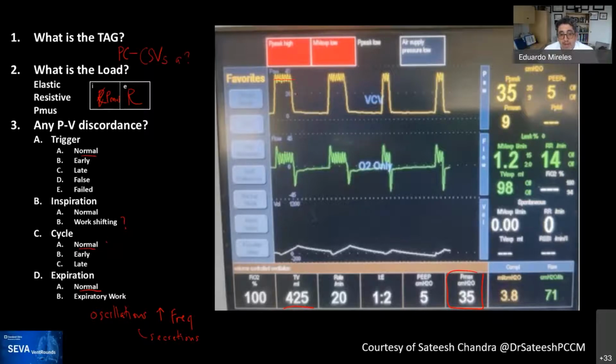And I will ask Rob, I mean, I think this is an Engstrom ventilator. I'm not entirely sure, and probably Satish can let us know. I see him on the line. And then we have these short breaths, so you have these two that seem to be of a set rate or a set inspiratory time. And then it changes to these smaller breaths, and I don't know what's cycling the breath right here. So Rob, what are your thoughts when you see this?